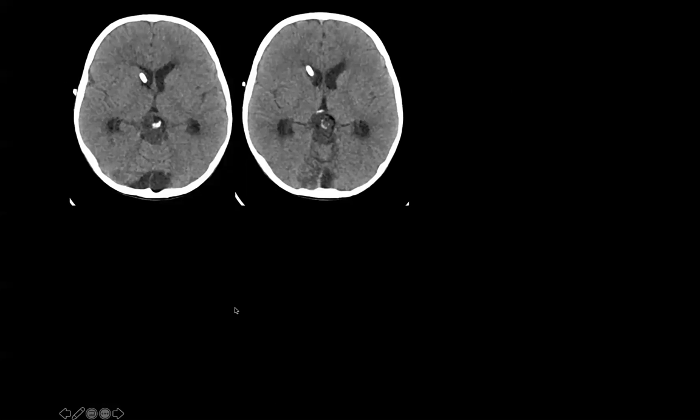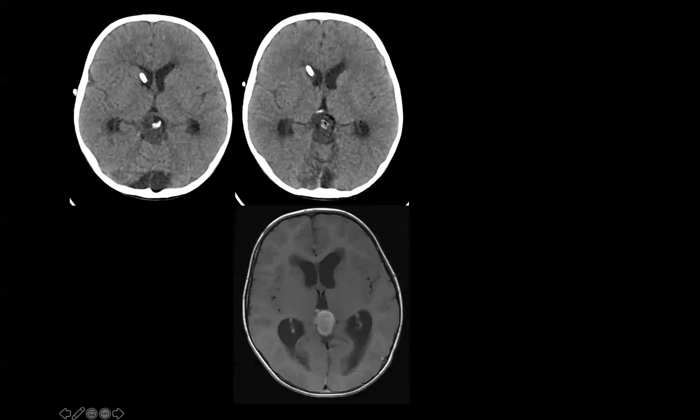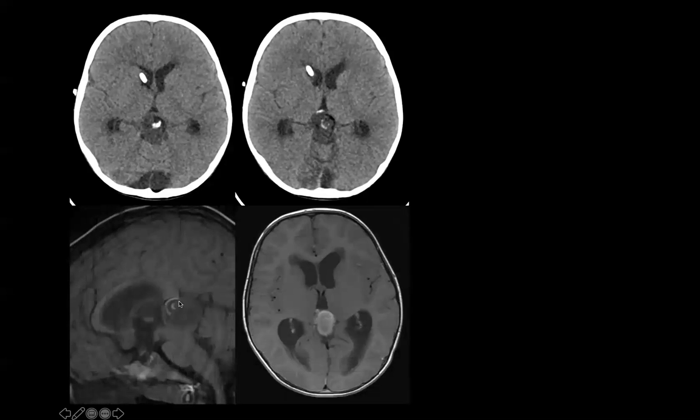Another very interesting case, this time is another mass in the pineal region, but it is hypodense. There are calcifications, but there are also these areas that are quite hypodense to the mass and to the fluid. So there is something different going on. And the mass enhances, but look at the T1. So this is T1 pre, this is fat.